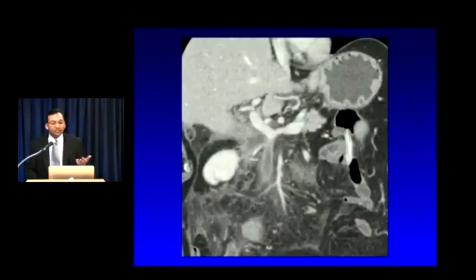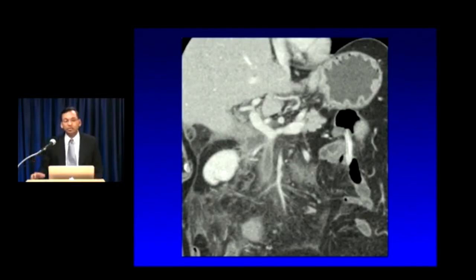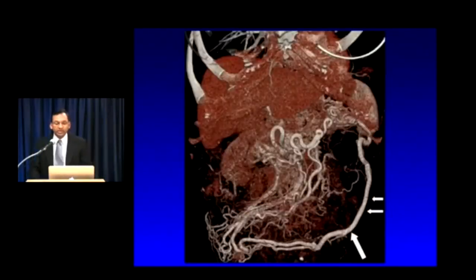Here's an example of an SMV thrombosis. These are easier than you'd think to miss on the axial images, largely because if you're going really fast and scrolling through the axials, it's very easy to overlook a short segment thrombus, but very easy to identify in a case like this when you look at the coronals. Here's another example. Again, even if you didn't see the thrombosis, the presence of these large gastroepiploic and omental collaterals means that you've got to have something wrong with your central mesenteric vasculature.